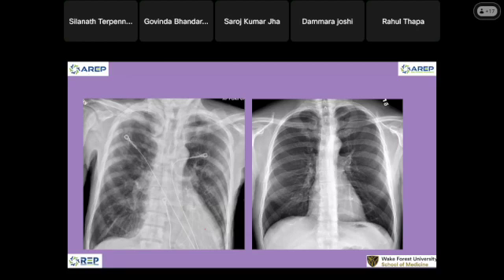If we don't have the patient, we have to just say, oh, metastatic disease. Either this person has prostate cancer itself, or a soft tissue mass in the neck, outside the mediastinum, with diffuse bone metastasis, because it's just so big now. So in a man, we cannot tell.